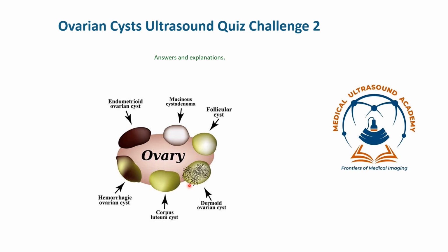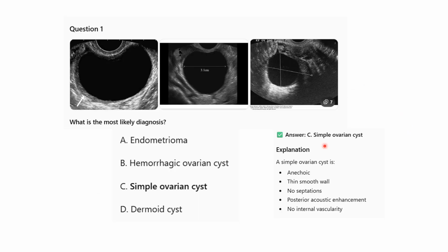Here are the answers and explanations to ovarian cyst ultrasound quiz challenge 2. So let's start with question 1.